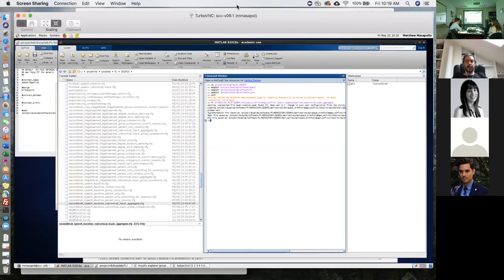The results now should be very similar to what they were before. They only should be a little bit more inclusive. So instead of cropping some portions of the brain, you should see some results. The regions that were being cropped were the regions where at least one subject, but it could be more than one subject, has been considered outside of the brain. And since we are not running the first level analysis, that masking is still there. It's only that they are now considered to have a zero effect for those individual subjects.